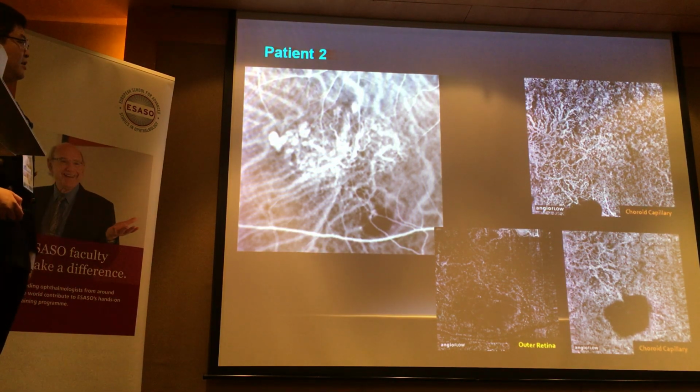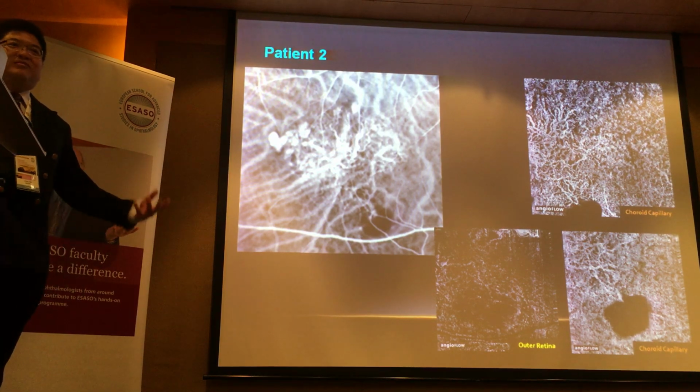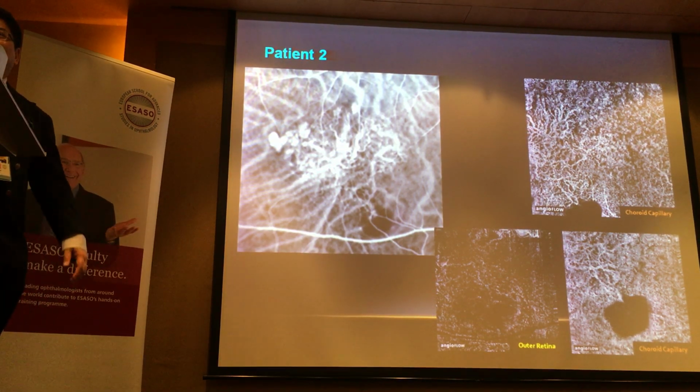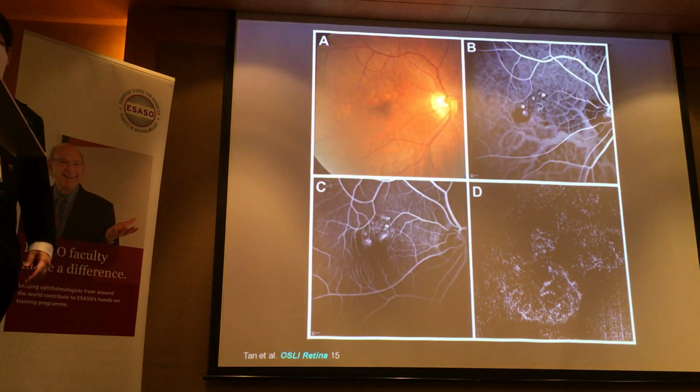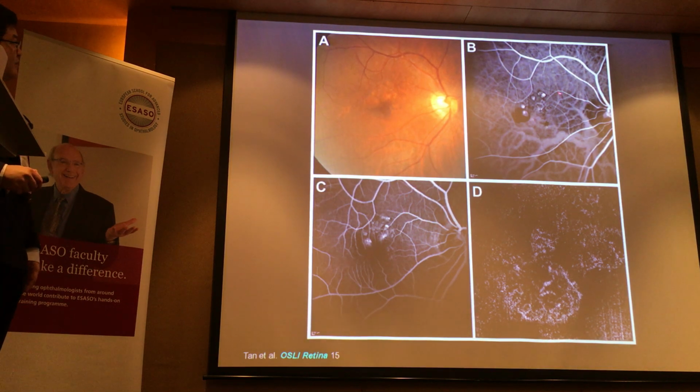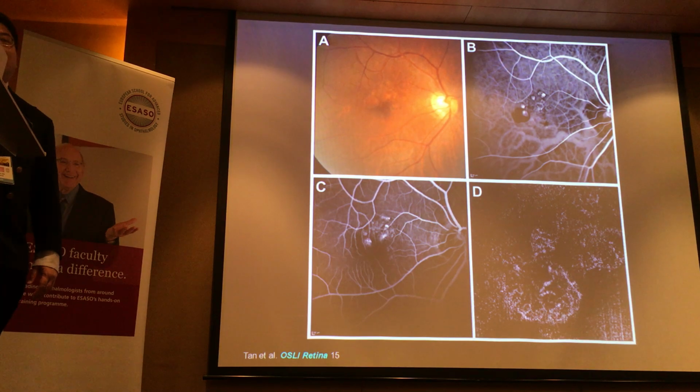All right, that's one option. But if I'm giving anti-VEGFs, then maybe some would argue, or have argued, that it doesn't matter then what the lesion is, although I may not entirely agree with that. Right, so again, another patient of mine, nice juicy polyps, absolutely nothing on the OCT-A.